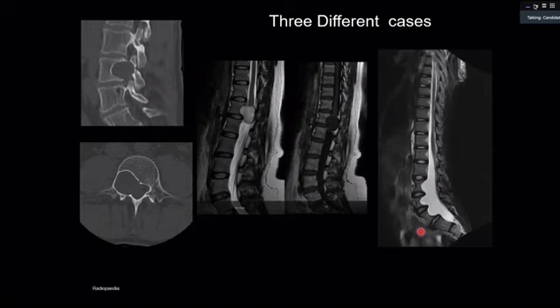This is also for differential diagnosis. On the top of my differentials would be a chondroblastoma. Yeah, that's all I got.